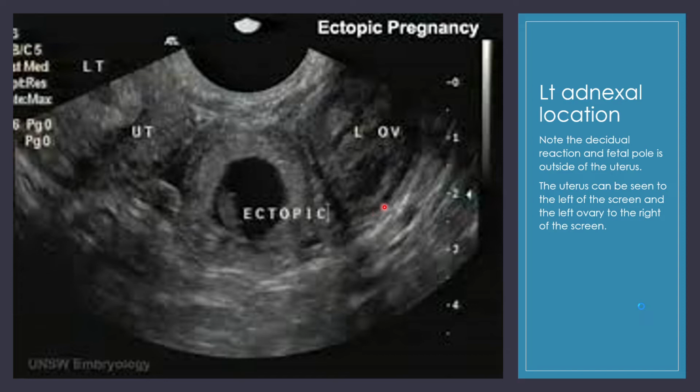So this is an ectopic pregnancy shown by endovaginal ultrasound. So here's an ovary. This is the pregnancy, okay? So this is the gestational sac. There's the baby there. And then the uterus is over here, okay? So some of these are more obvious than others.